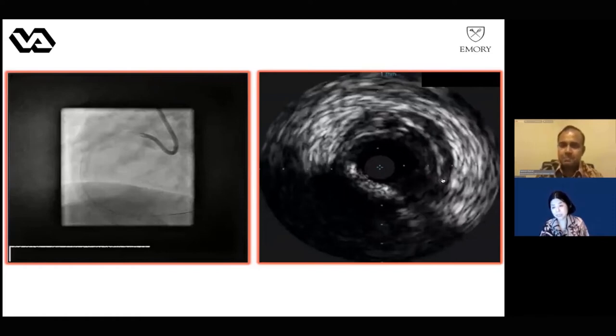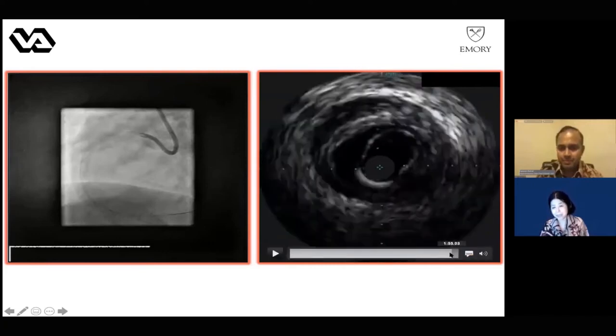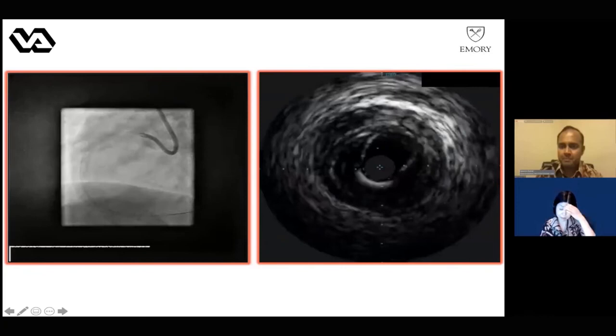And you see the, yeah, so that's a very clear hematoma. That's indicating what we see by, yeah, even this is more, you see the hematoma on top, that's very clear. So that's a very typical intramural hematoma. Typically, the intramural hematoma is hyperintense and helmet-shaped, pushing into the lumen.